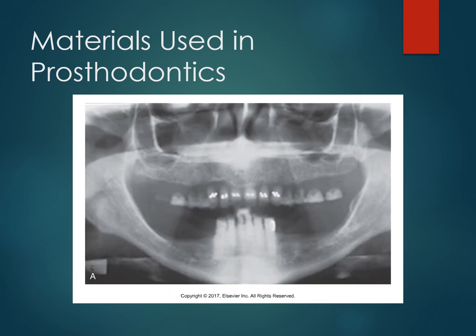See how these teeth are kind of just floating? They don't have roots. And then the bottom, you can see that patient has those teeth there, but it looks like they didn't have the patient stand up straight. And that is why we have this sort of white blob right here, right? Because the tube head, as it went around the back of that patient's head, actually bumped into the back of their head, back of their neck. And so this is someone who didn't stand up straight inside this panoramic, and also they didn't remove their full upper denture.